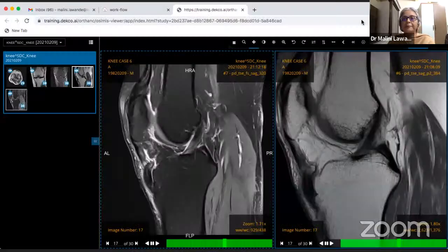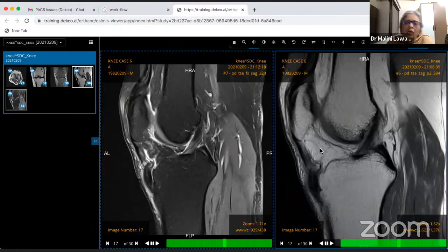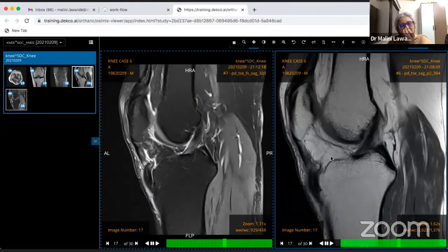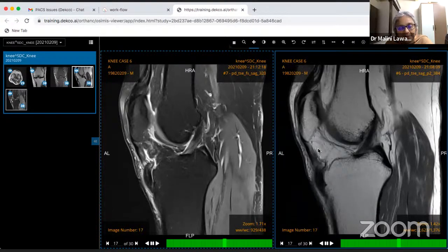Okay. So we were looking at Hoffa's fat pad. This thin linear structure is the infrapatellar plica. Sometimes you have pathologies here, like you may have edema or scarring. Somebody who's undergone arthroscopy, we just see some scarring out here, and if it's mild scarring, that's normal. Only when it is very diffuse and extensive, we'll call it arthrofibrosis. You can get Hoffa's fat pad impingement.